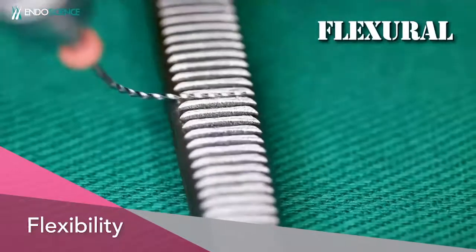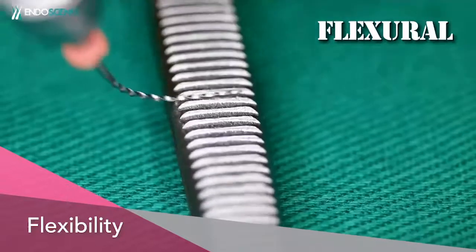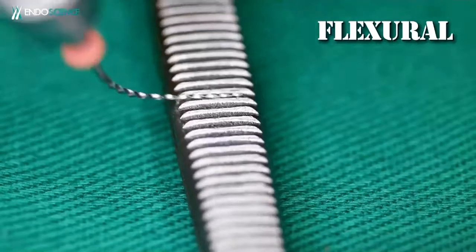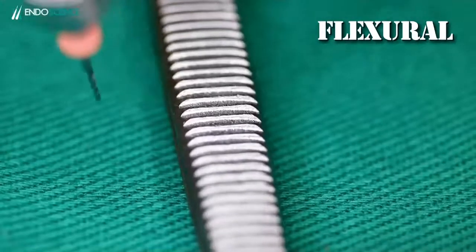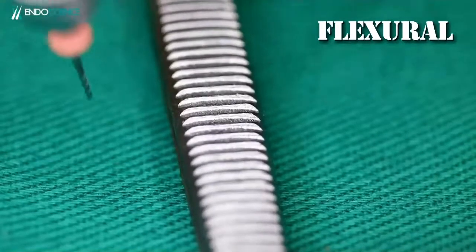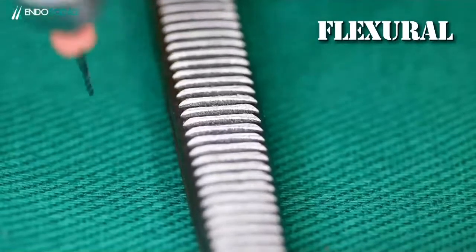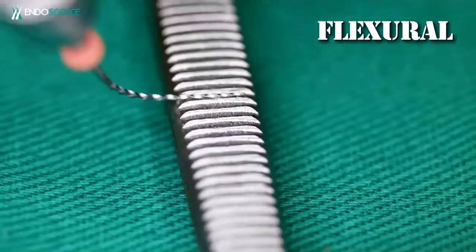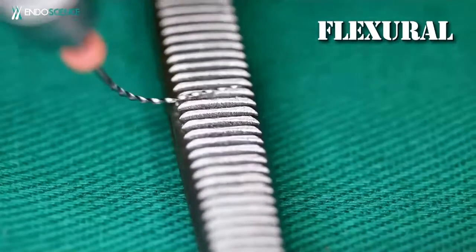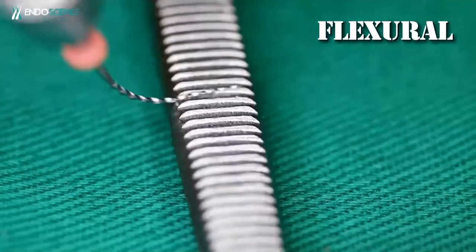When I have a file in rotation in a curved root canal, we have a point of stress and it can break if you don't use the right movement, pushing it in and out of the canal. This is important. Even with a flexible file, we need to use the movement in the proper manner. But a flexible file, with a more flexible alloy, will avoid this kind of fracture too.